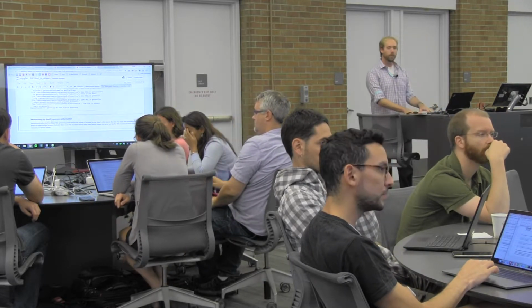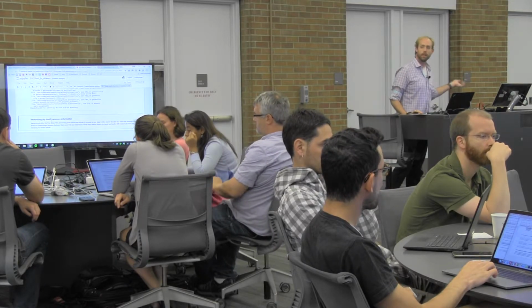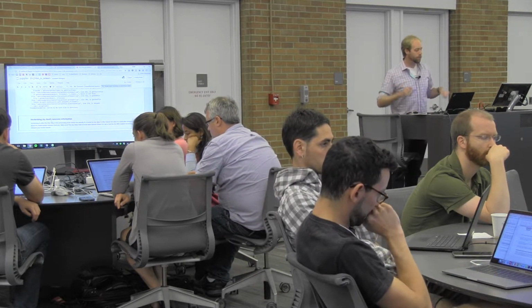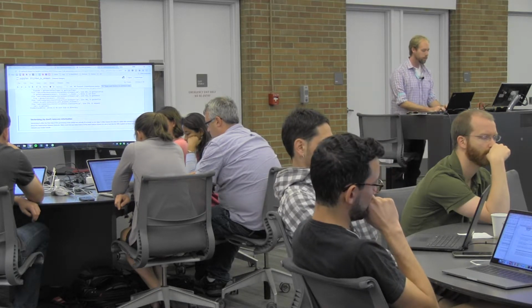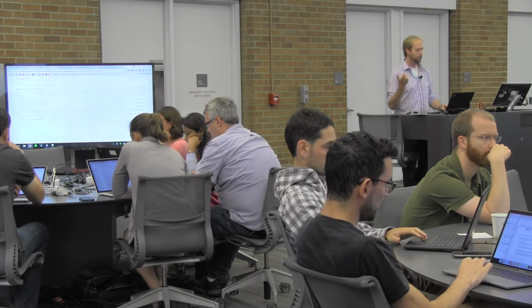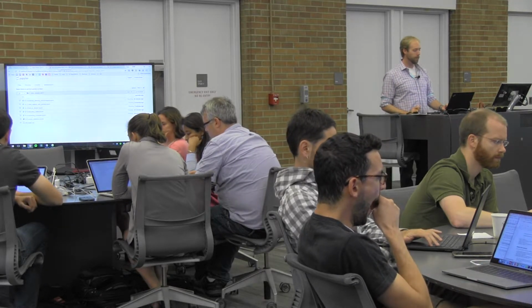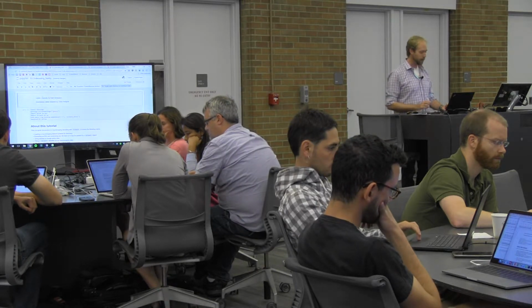Okay, so this is the way that we can go from a set of neuroimaging 4D data. We can turn it into a Scikit-Learn style n samples by n features array. And now we've gone back to the original 4D data. So what I want to do in the next notebook is talk about that process in the context of a specific experiment in neuroscience. And this is the 1.3 Decoding Haxby notebook, for those of you who don't have broken Jupyter hubs right now.